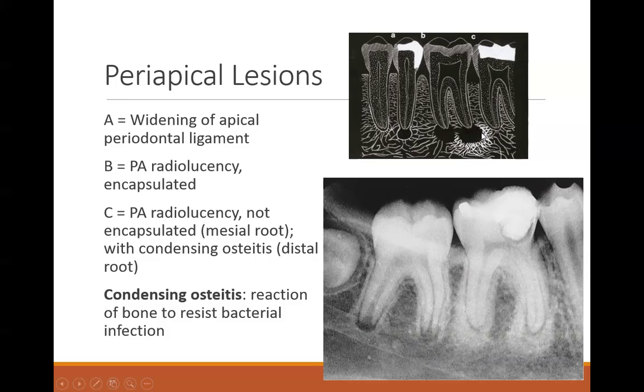The body's trying to wall off this infection and protect itself, and that's called condensing osteitis. It's a reaction of bone to resist the bacterial infection. So you can see a little bit of those stages here and here. This is condensing osteitis. Sometimes that hangs around even after the root canal or the infection has resorbed, but it's just the body trying to wall off the infection.